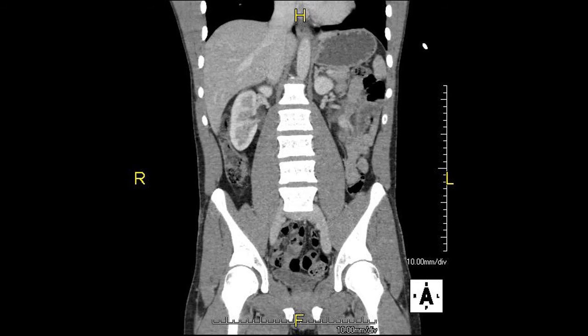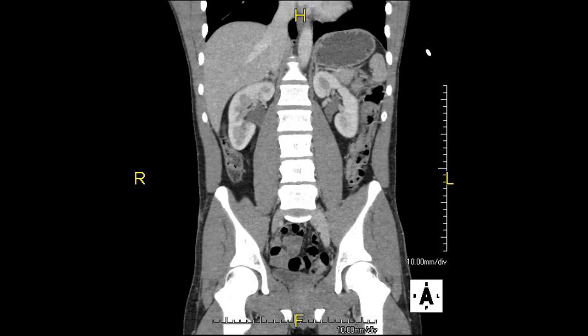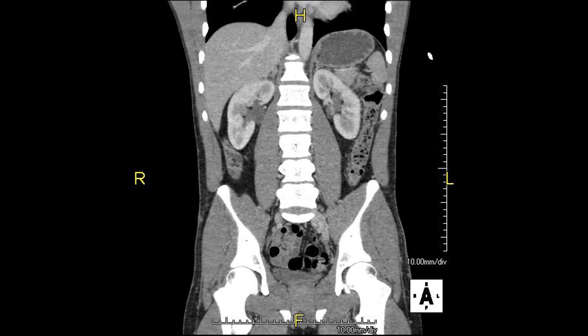The left kidney is starting to come into view here, and I'll circle that in green. Its entire shape will become more visible in the upcoming slides. Here, both kidneys are now clearly visible, as well as the renal pelvis, which is a darker gray than the kidneys. And I'm just going to outline the edges of those right now in yellow.